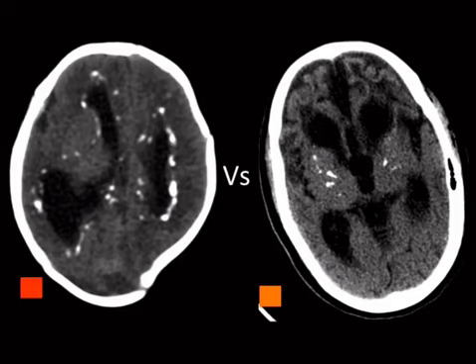So on the red, you can see that there are calcifications that are centered around the ventricles, periventricular, you might call them, and then on the orange, they're primarily centered in the basal ganglia. So on that alone, you should be able to give the two main things that do this. But I'm also going to point out the fact that there's clear hydro on this one too, which is the other thing that's helpful.